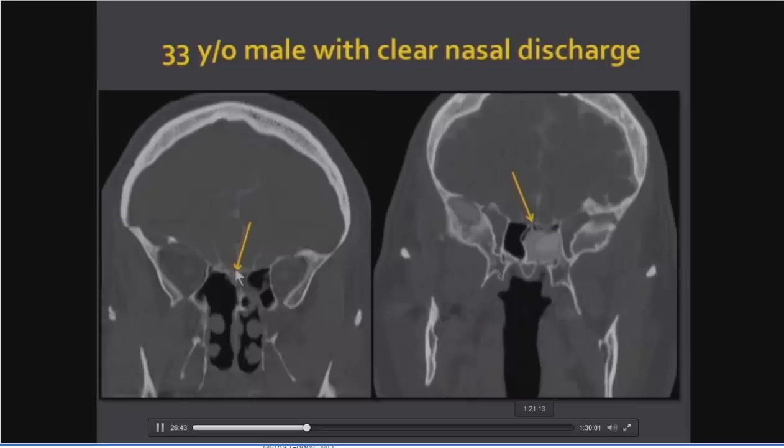And this is leakage into the cribriform plate. One word of caution here is that sometimes discharge, which is along the superior aspect of the nasal cavity, can look bright. So at our institution, we tend to obtain a non-contrast image to compare with. Otherwise, you do not know if this is truly iodinated contrast or not.